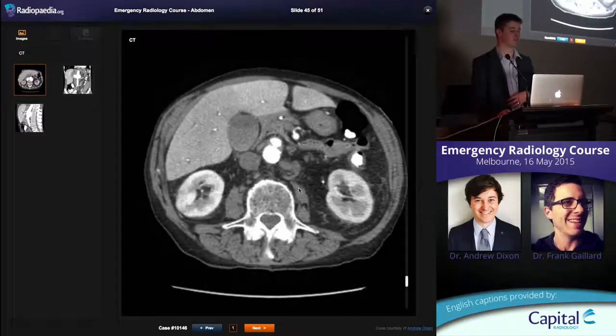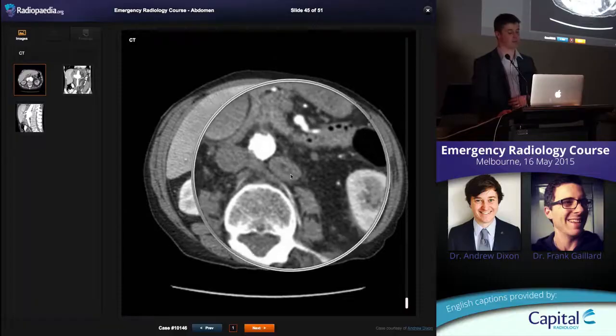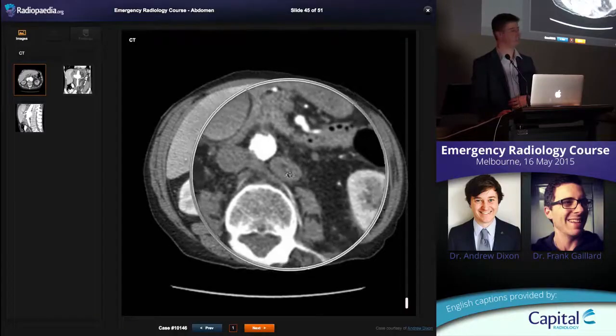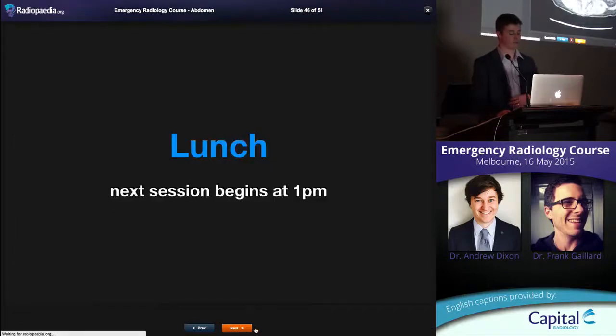This was Staph aureus. Nice example of reactive lymph nodes next to it. Enlarged lymph node. Looks like a kidney, just a small kidney. Right. Nice fat coming into the centre of the hilum of the lymph node and a reniform shape.